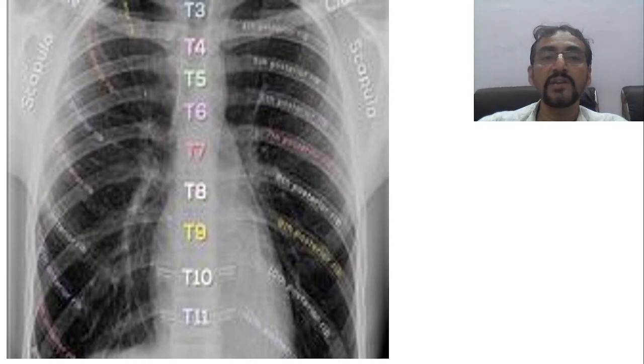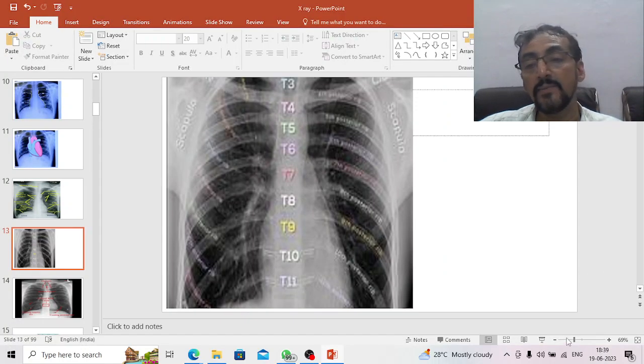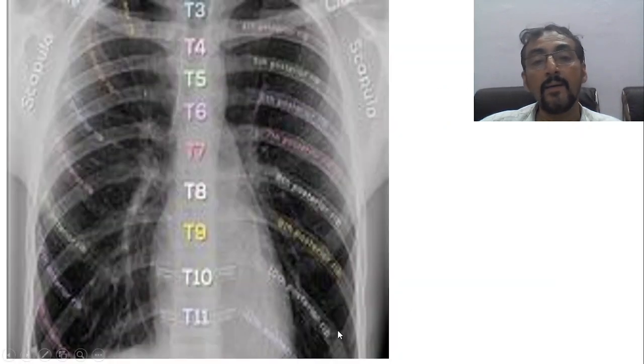तो वो कितना straight होना चाहिए वो देखना बहुत ज़रूरी है. तो T11 vertebra, T10 vertebra, ये सब दिखाई पड़ता है. Okay, तो ये सभी आपको दिखाई पड़ रहा है यहाँ पे. And these are the ribs, you can see this is the anterior rib and this is the posterior rib. ये जो ribs है, ठीक है. तो intercostal space ये आ गया, इन दोनों के बीच में एक intercostal space है. तो इस तरीके से चलता है.